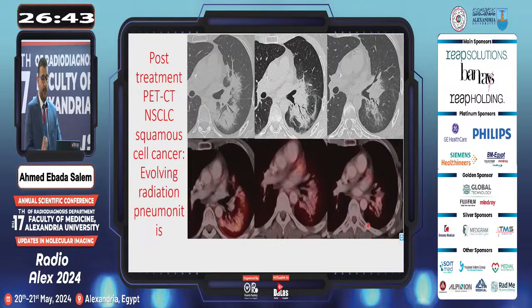PET-CT can also be helpful for navigating post-treatment inflammatory changes. So this patient had radiation to their lung cancer. He had a non-small cell lung cancer. You can see there is diffusely increased uptake related to peribronchovascular interstitial thickening within the left upper and left lower lung lobe. And he repeated the PET-CT over the course of 1 year, and as you can see, the extent of uptake as well as soft tissue correlate is decreasing. So this is consistent with radiation pneumonitis.